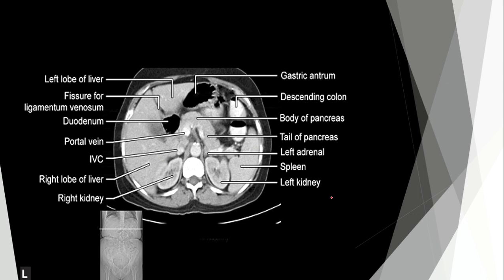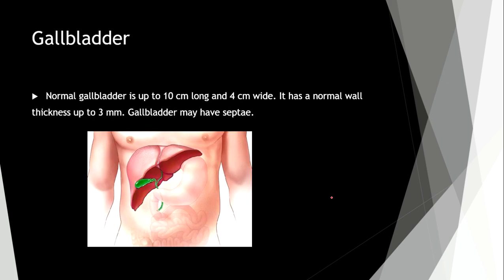Make a pause on these slices and read every part, and try to define where you see every part of these slices, because it's normal. You must first of all read how it looks normal, and then you must go to the pathology. Look precisely at these pictures, try to define every part, every organ in the abdominal cavity.